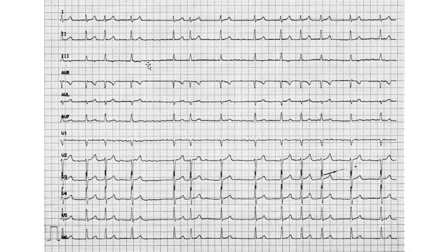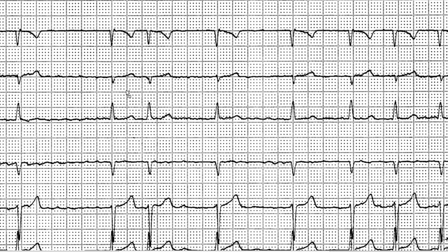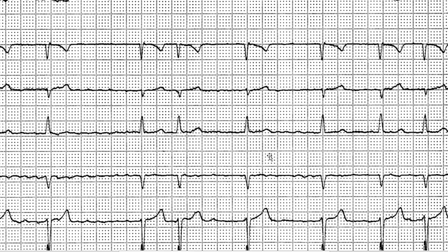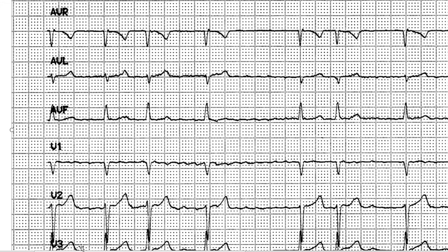So the FF interval is going to be very tricky. 1, 2, 3. Say about 3, 3.5. I'd say about 3 roughly, the distance between the peaks. It's very hard to say, to be honest. And oh, I can zoom. Oh snap! I forgot I can zoom in. Wow, I forgot that. Okay, so let me just zoom in and move to the area.